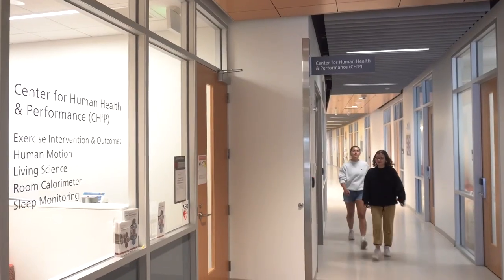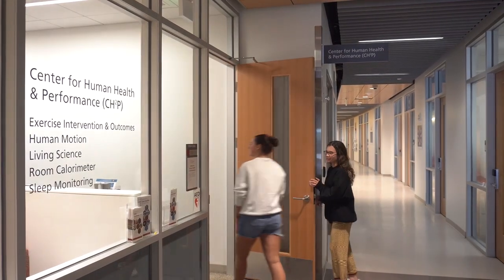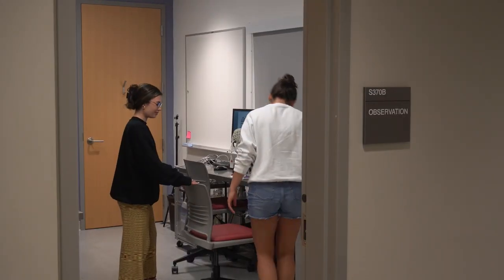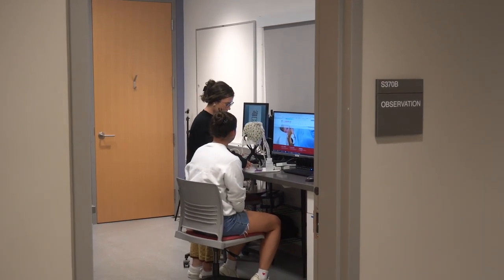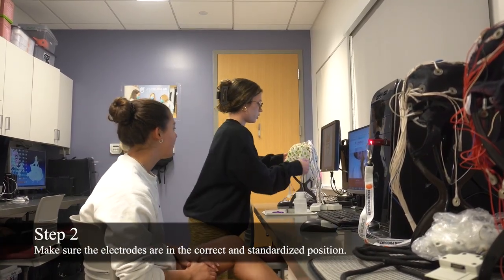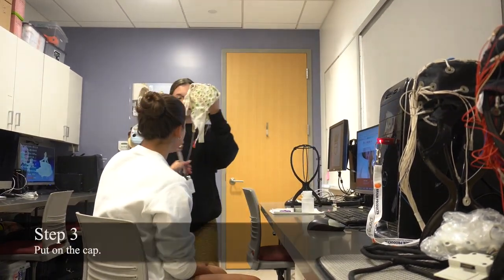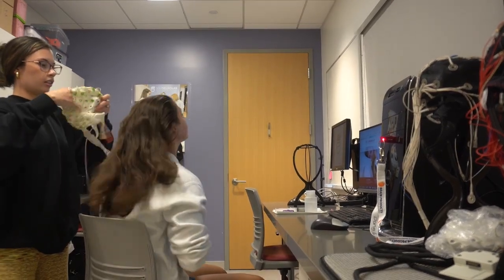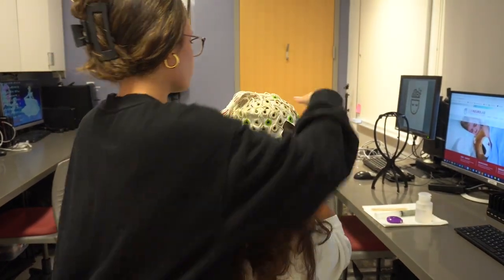EEG allows us to objectively examine changes in brain activity, eye movements, and muscle activity that we could not see by simply observing. During an EEG recording, small metal electrodes are placed on the scalp. When placed, electrodes detect fluctuations that are caused by electrical activity of neurons communicating with one another.